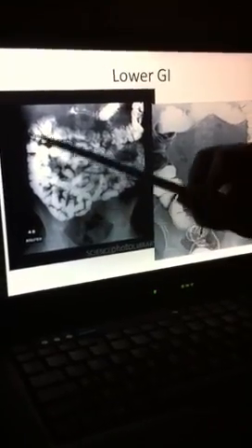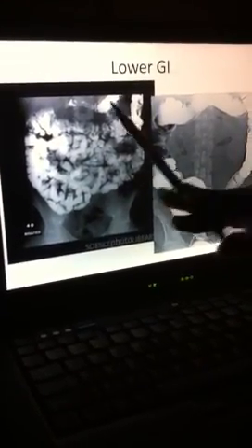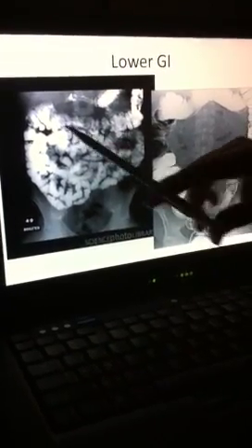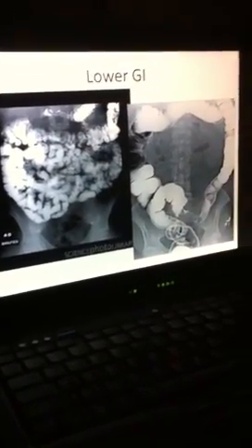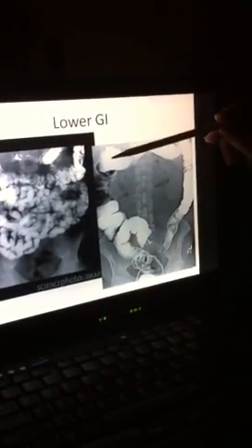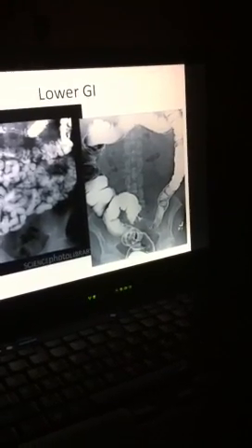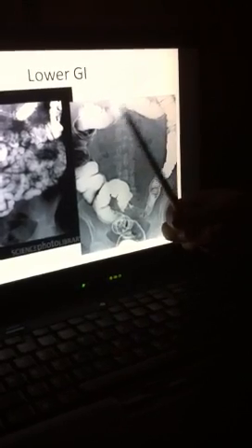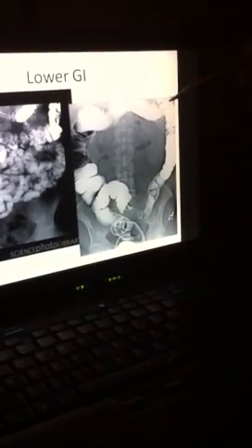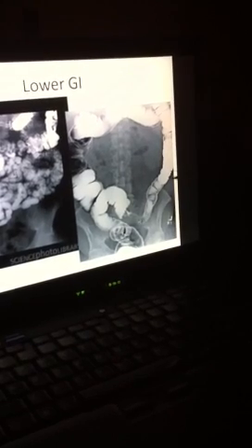And then you have this right here. Ascending colon. And you can see a little bit of the transverse colon. Yep. This image is just the colon. So you have all the parts of the colon here. This is? Ascending. Transverse. What is this? Hepatic flexure. Yep. Or right colic. Whatever you want to say. And this. Transverse. And what's this? Splenic flexure. Descending colon. Sigmoid.